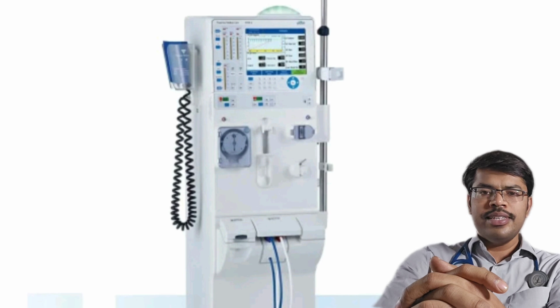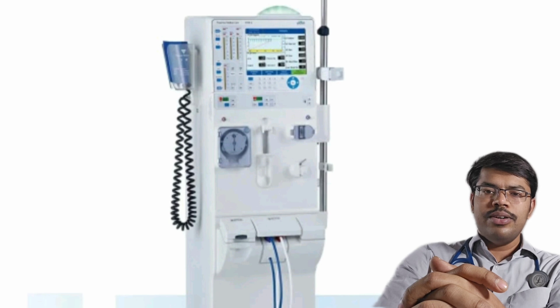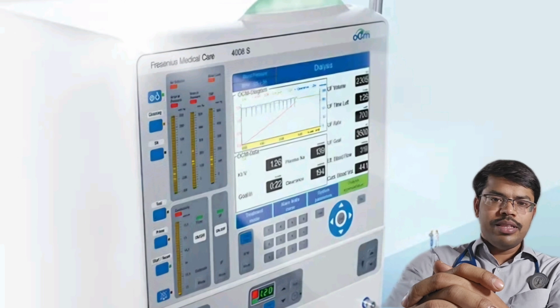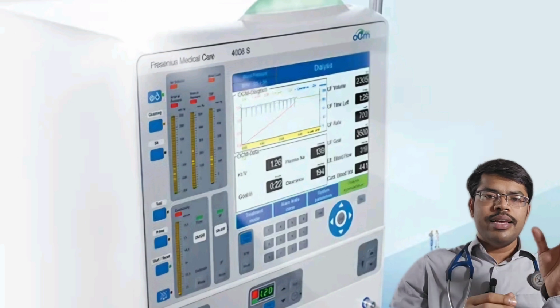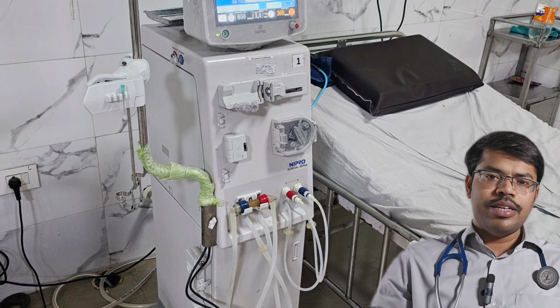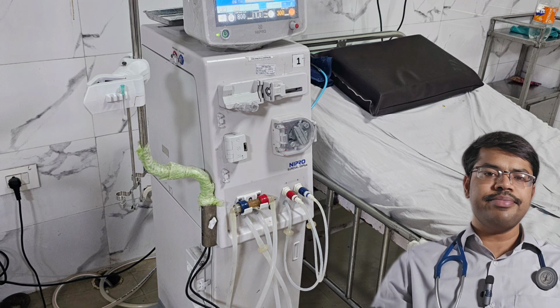In this video, we will see the parts of the hemodialysis machine. It is important for dialysis technologists to know the external anatomy of the hemodialysis machine. At least for the DM nephrologist, you have to be thorough about all the components of the hemodialysis machine and its circuit. The external anatomy can vary from machine to machine and model to model. In general, as you see in the background, the machine consists of these external parts.